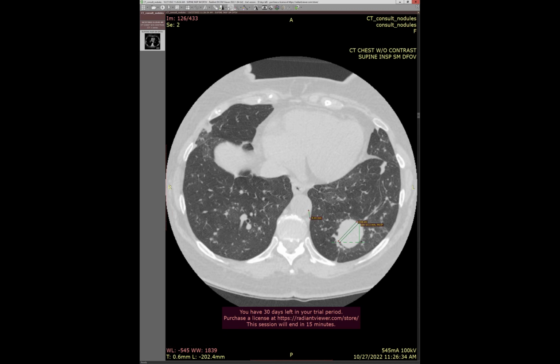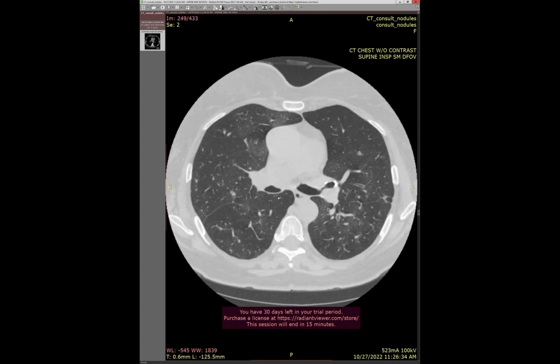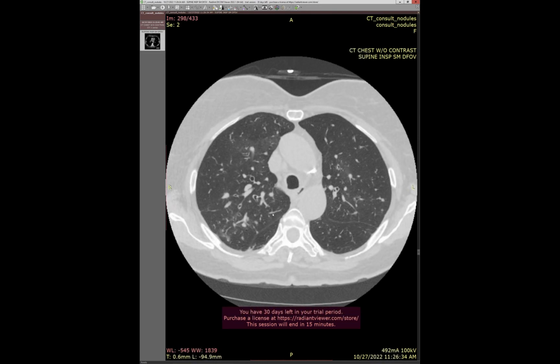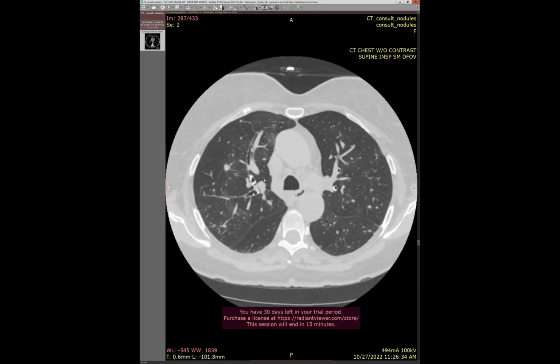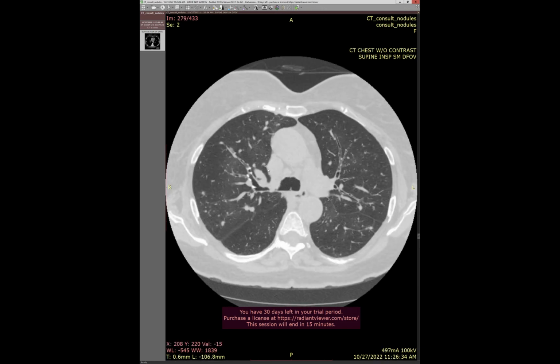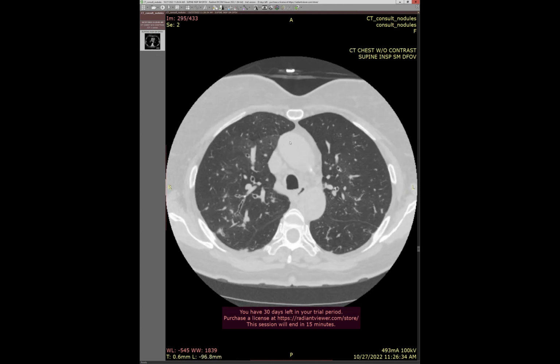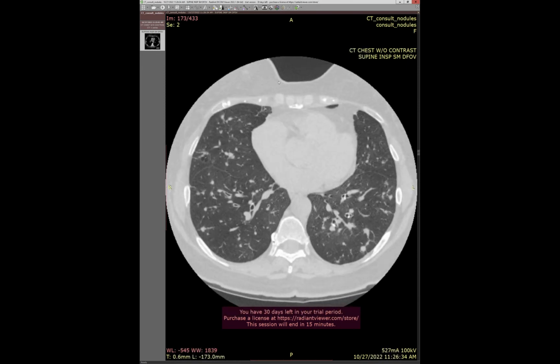Anyways, very slowly growing. And one of the conspicuous findings is small airways disease, both large and small airways disease. These airways aren't normal. Some of them are bronchiectatic. They have a very corrugated appearance. And then we have the mosaicism. So actually when I read this study back in, I think 2018 or 2019, I kind of hedged and hawed. I didn't know what it was.